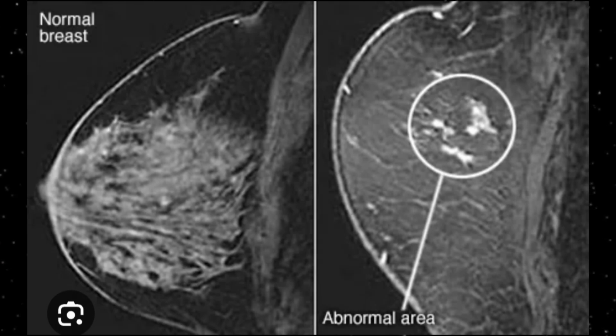Whenever there is doubt on the mammogram or on the ultrasound imaging, MRI should be considered, and it would be able to clarify the lesion if you have seen it on the mammogram and it is still confusing, or if there are any abnormalities on the ultrasound imaging and yet you are unable to make your diagnosis. So the MRI would be the only answer.